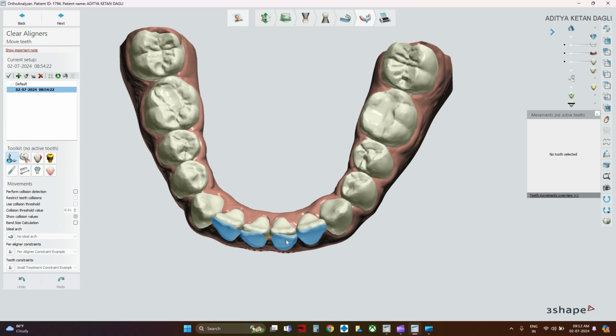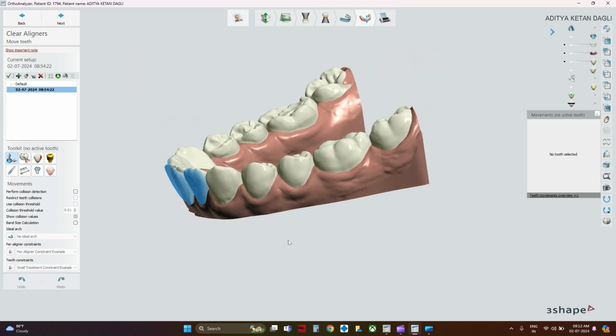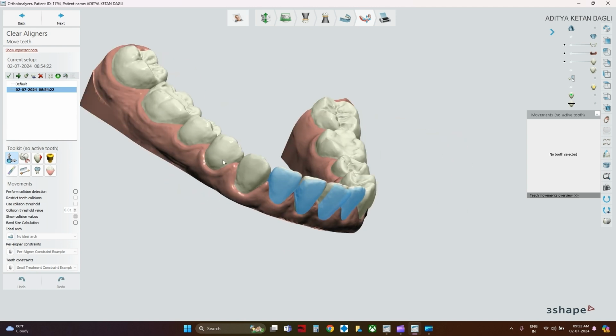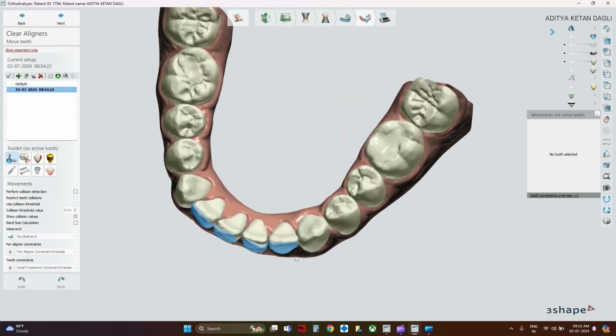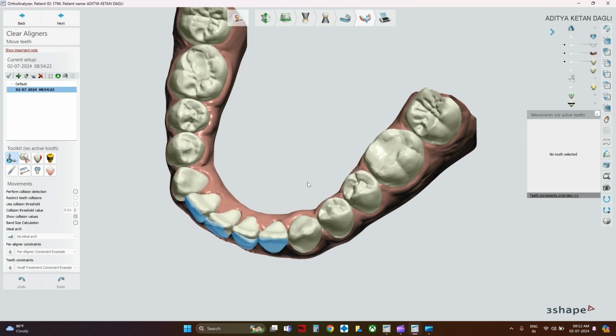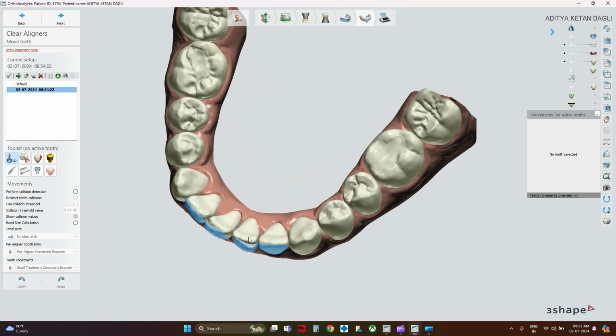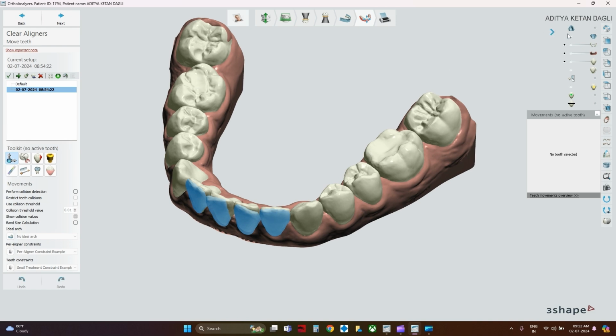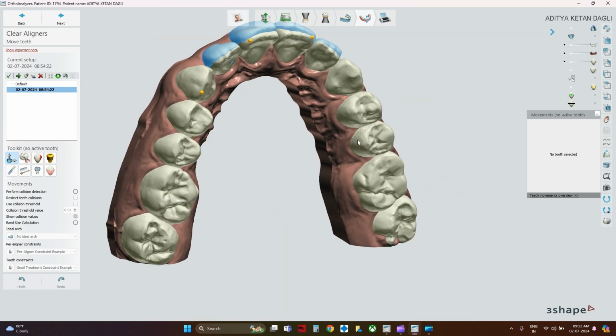If you notice, our core movement is restricted to the incisors in the lower arch. So we will add two anchor attachments, probably one on the premolar, one on the molar, repeated on either side. And we will add some attachments on the two central incisors at least, which will help us direct the rotational forces, and if possible we'll complement that with a negative attachment on the opposing side to create a nice couple to facilitate the derotation.